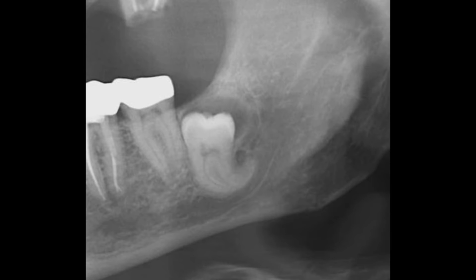As you look at this canal, there's also a little bit of narrowing at the very tip of the apical portion of that root tip. You see the canal is wider as you go more proximal, and then as you come forward, it narrows as it reaches the root tip of number 17. That is, again, another radiographic sign that you want to be aware of, and you do your CT scan or you talk through different options.